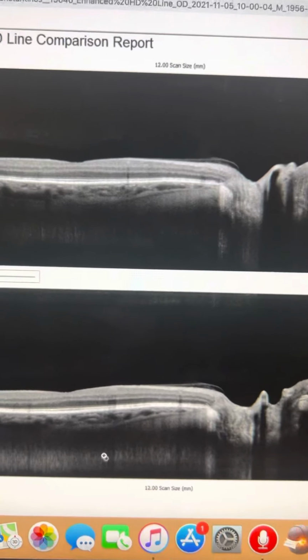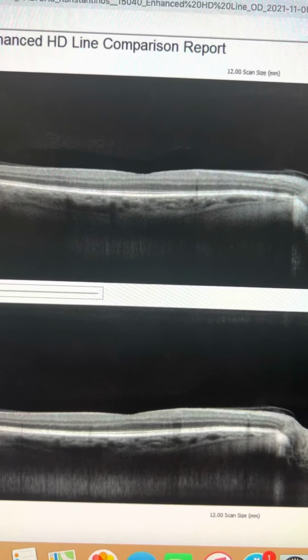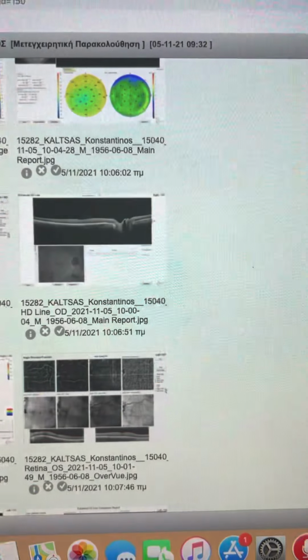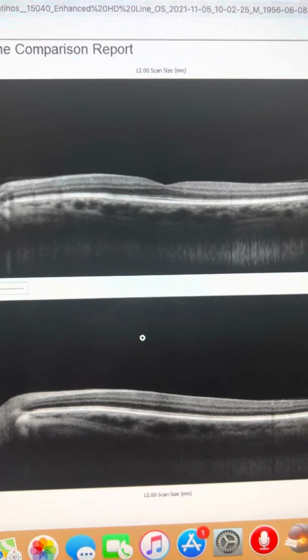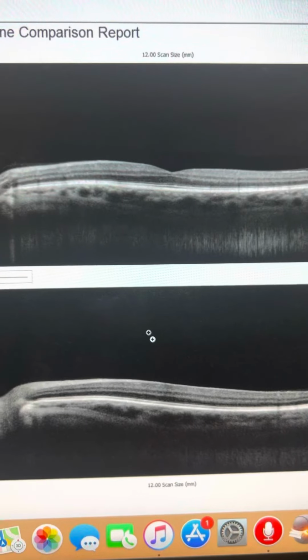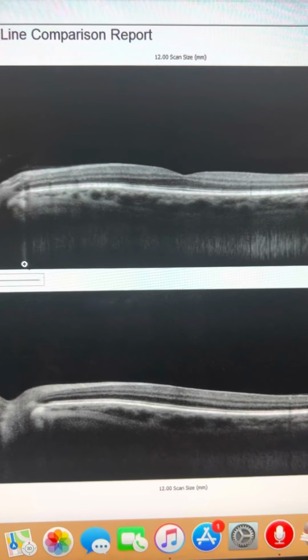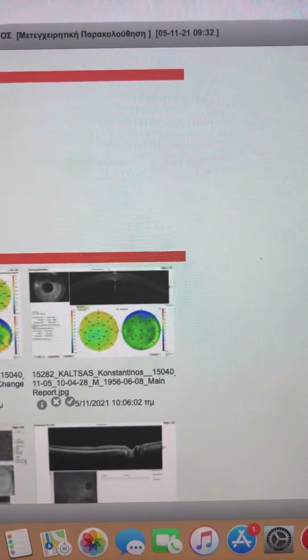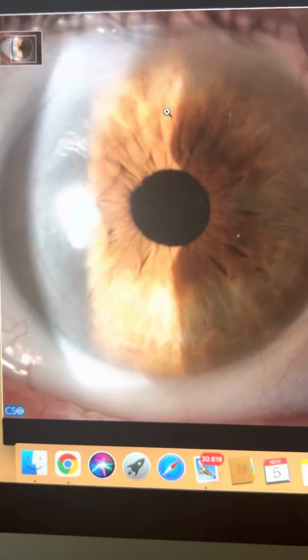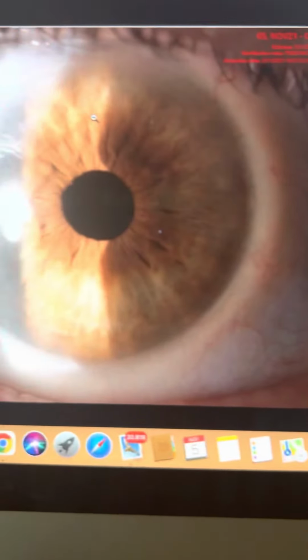This is again the comparison of pre-op to post-op, another area where we spend special attention and special care. So we saw the right eye comparisons, and this is the left eye comparisons of pre-op to post-op today. So, uneventful healing after cataract surgery. We're very pleased that we can reinstate the clarity and uncorrected visual acuity for this gentleman.